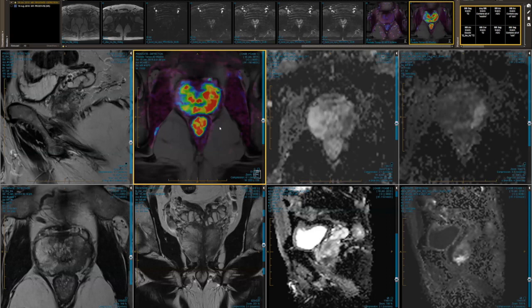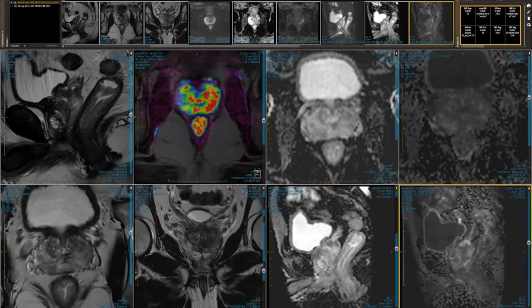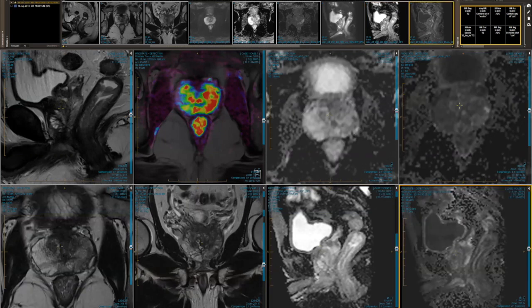We've got a comment from Declan Murphy from Peter McCallum here in Melbourne, who says, "We love the sagittal views for surgical planning. It's a fantastic roadmap to the bladder neck." And Richard, you've also mentioned sometimes it can be pretty useful. In fact, we've got a case later on which we might demonstrate the utility in the sagittal plane. But what do you think the time difference would be?